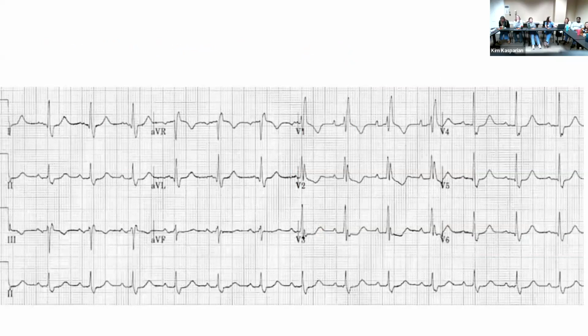All right. So you have probably kind of a 50-50 shot based on what I just said. All right, so we got one vote for right bundle branch. Anybody want to challenge him?